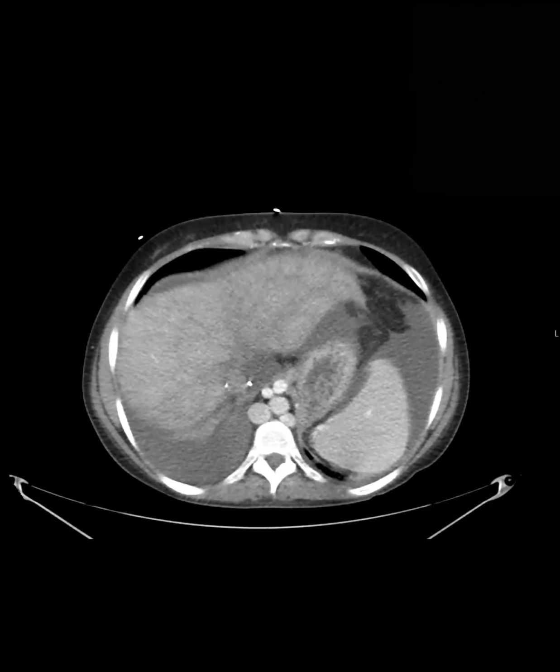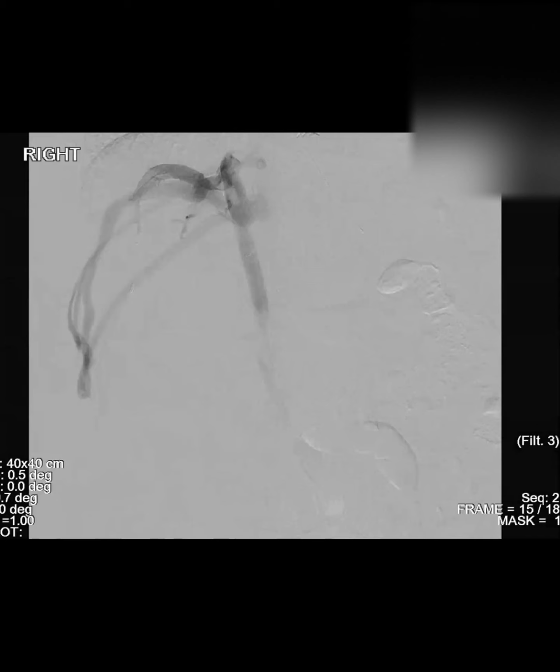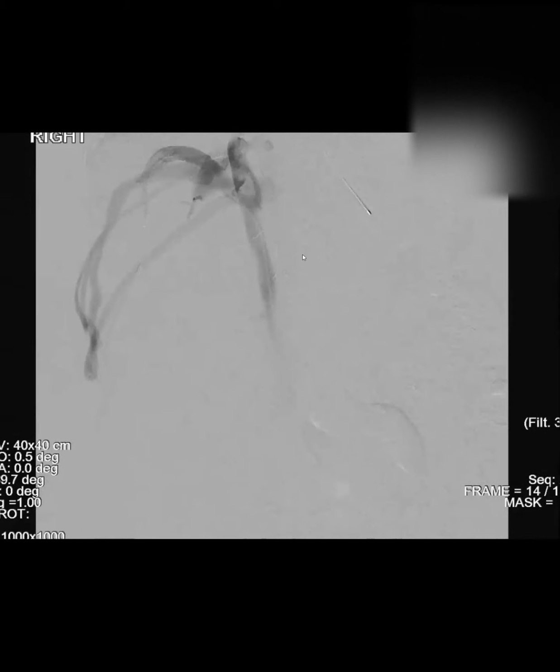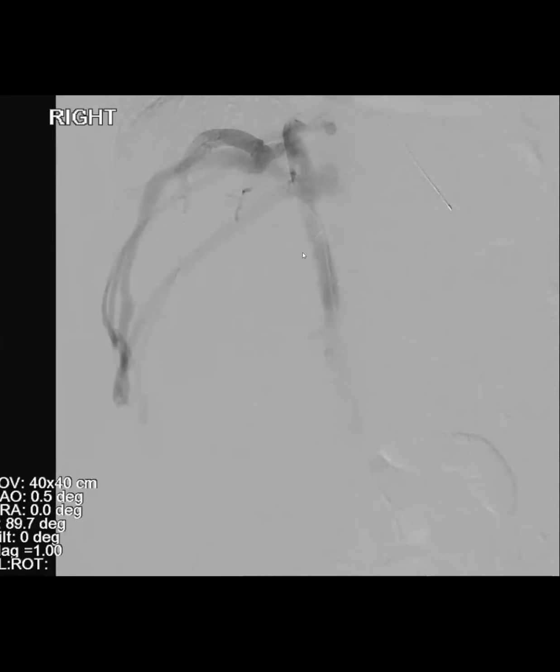And then I'm just going to jump to their angio images. And you can see on angio, when they injected the IVC, nothing went above this level here. So they're still really shunting through all of these intercostal varices into the systemic circulation. Does that make sense?